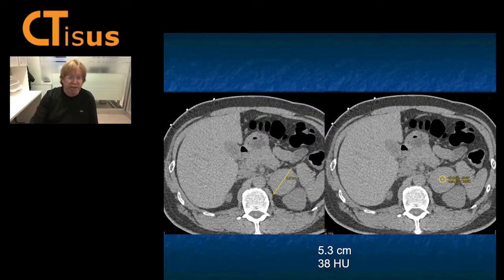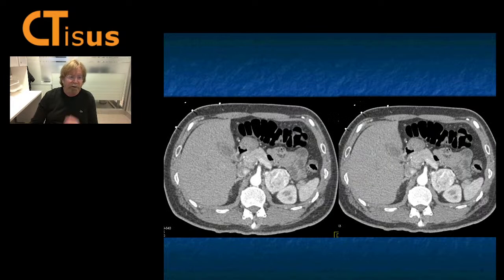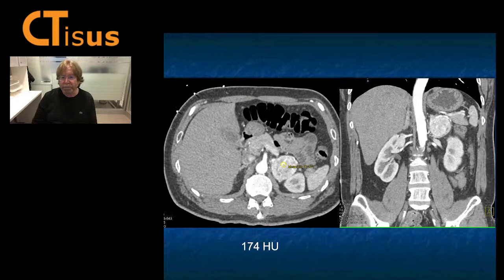So we give contrast. Look how bright the lesion is. When you measure that, it's going to measure between 170 and 200 Hounsfield units. What is super bright? Pheochromocytoma is what comes to mind. We think about METs, particularly from renal cell, melanoma. Those are a thought, but typically not this bright. And the patient did not have a known malignancy. We talk about primary adrenal cortical carcinoma, which often is vascular and necrotic, often larger. In theory, you could think about it. I can't say it's an impossible diagnosis, but you would look at the metanephrines and they were off the wall, so you know this is a pheo.